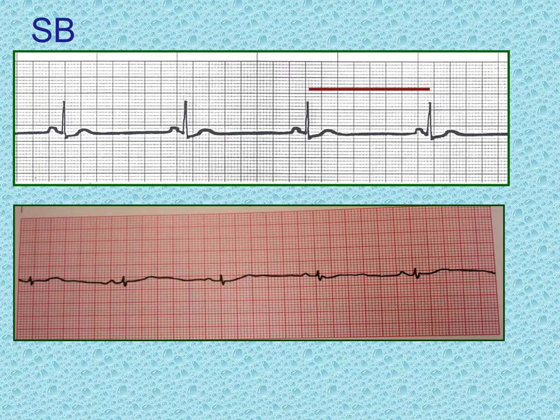The complexes are a little bit smaller, so they're harder to see, but they're still in existence.